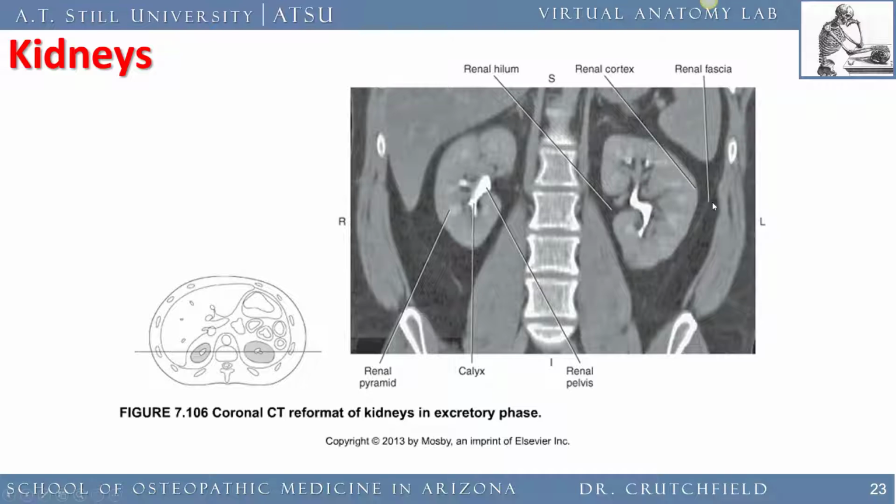But what we can see here, there's renal fascia right there, separating perirenal fat from pararenal fat. Some textbooks will point directly to the kidney and tell you that Gerota's fascia is this tiny, adherent, almost thin saran wrap on the kidney itself. And other textbooks show us that it is the fascia here that makes up Gerota's fascia. I don't really care, because once you get into the abdomen and you're back there playing around with Gerota's fascia, it's usually a bad day because you've got a kidney that's bleeding and you need to go explore and look at it. So our calyces can be seen here. The renal pelvis can be seen here. And we can't see yet where the pelvis is going to give us the ureters.